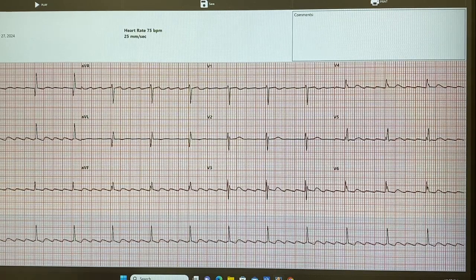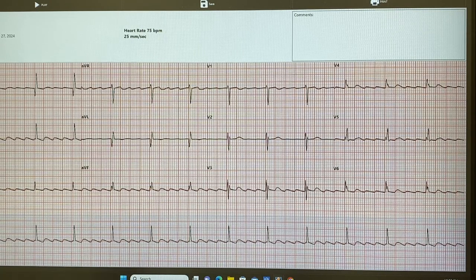Now we're looking at our P waves, which are not there, because we said the P waves are the first to disappear. Well, true, but could there be multiple T waves? No, because then that means the heart is constantly resting for multiple. Right, doesn't make sense. So then these are most likely multiple P waves.